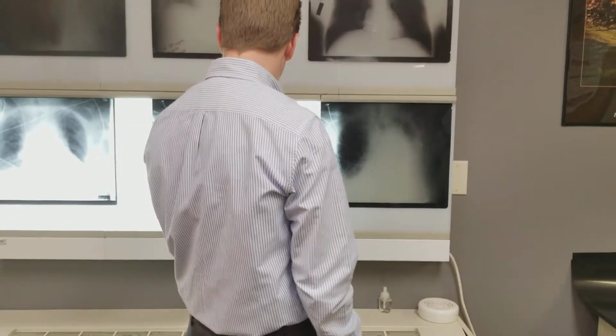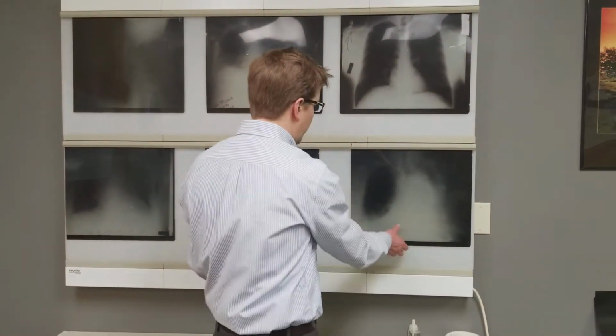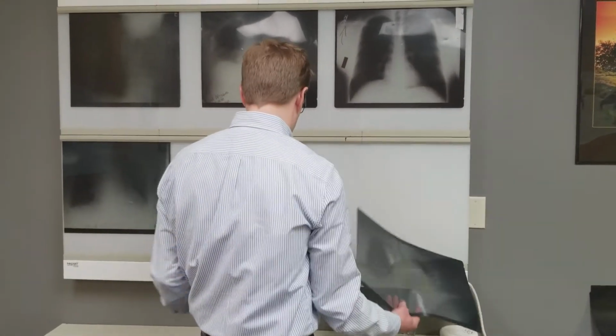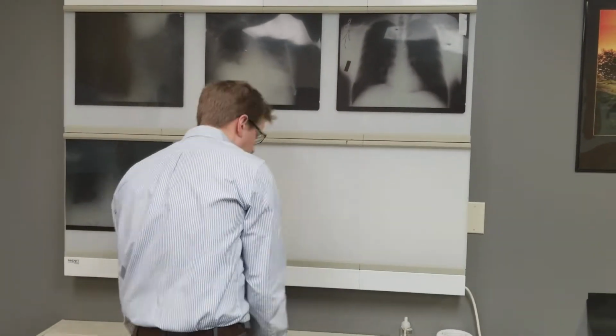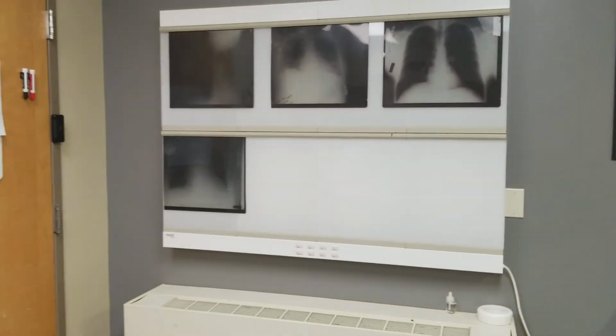We're going to look at just a few more images, and I'm running real fast because I don't want a video to last half an hour. Just kind of want to get to the point. This over here.